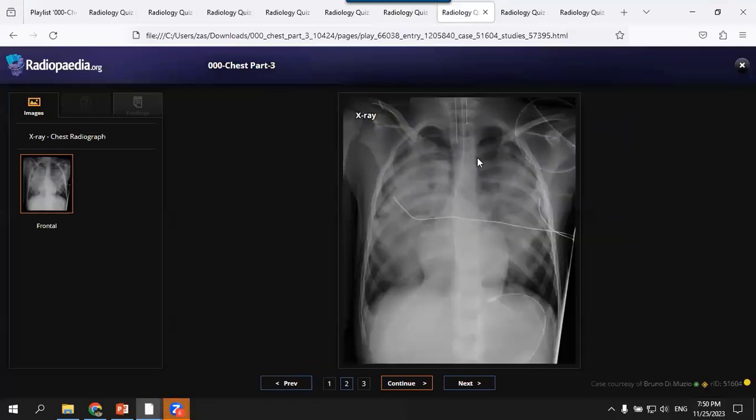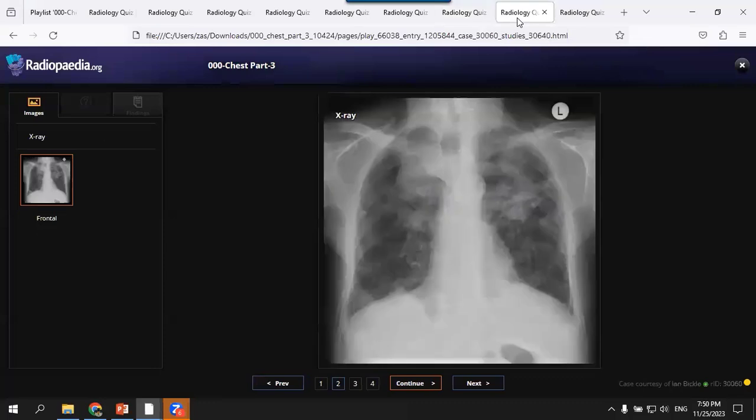If the patient has a history of trauma or intracranial hemorrhage, it may be non-cardiogenic. This pattern is a batwing, but the peripheral pattern is called reversed batwing. Okay, patches in the upper part of the lungs.